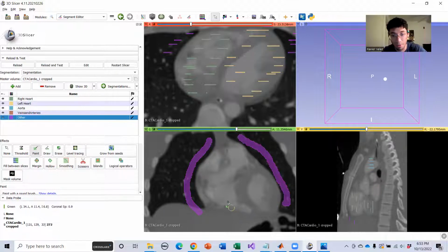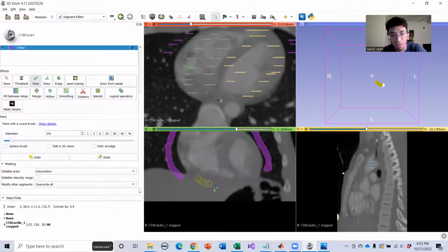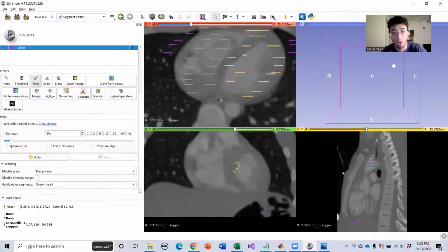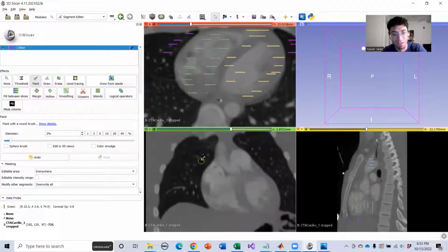If you do have the time, why not take the extra time to make it a little cleaner? It'll save you time in the future when you need to manually do things. But for our first pass, let's just do it. Let's just draw, like we're young.